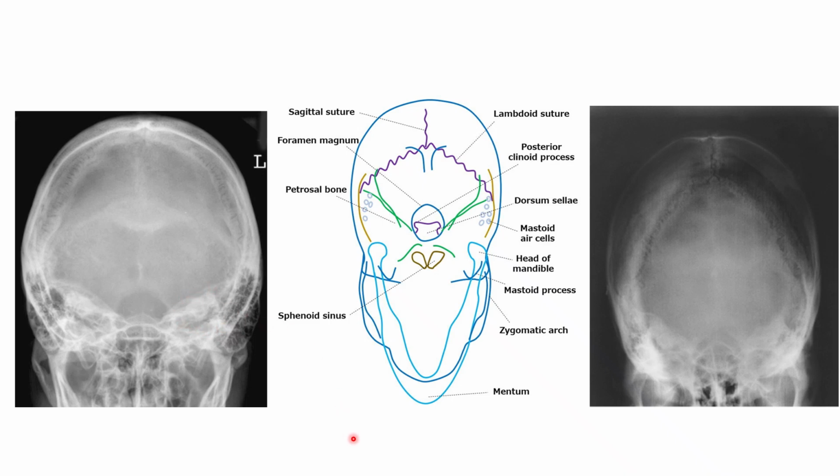Just two specific parts of anatomy you can go straight to. So for tilt, you can look for the mandible, those condyles of the mandible. You can also look at the petrous ridges. I guess the petrous ridges also show up very clearly. So on tilt, you could easily see tilt if one of the petrous ridges is higher than the other petrous ridge. That would identify tilt, right? So tilted, if the vertex is tilted towards the right side, then everything on the left is going to come up higher. Everything on the right is going to come down lower.